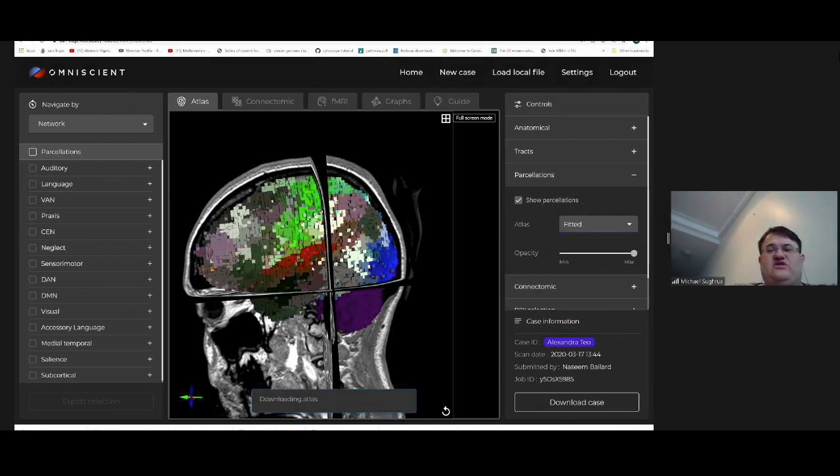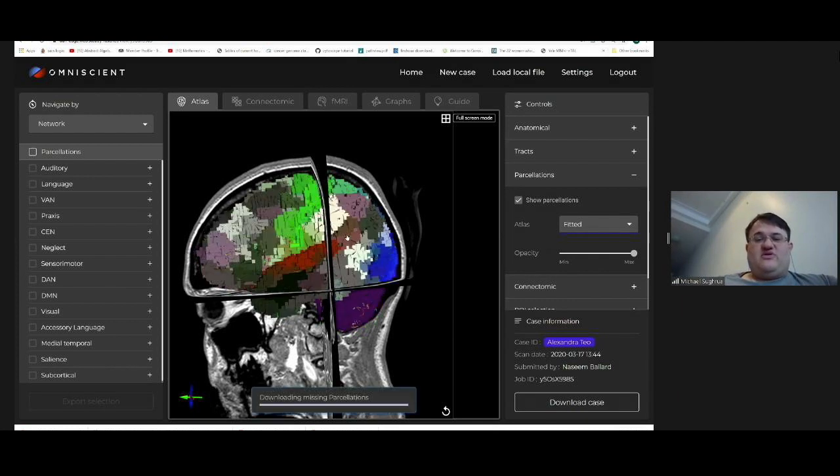So to give you an example of how this works, we start with a non-machine learning atlas as our prior. We use this to restrain some of the connectivity, the machine learning, to prevent it from looking in crazy places for the Broca's area. So we don't expect the Broca's area to be in the occipital lobe. And as you see, it starts with an atlas like this that's relatively smooth. It's got clear, nice boundaries, but it's probably not reality. Some of those voxels, if you've ever spent any time with atlasing, will inevitably be in sulci, the Sylvian fissure.